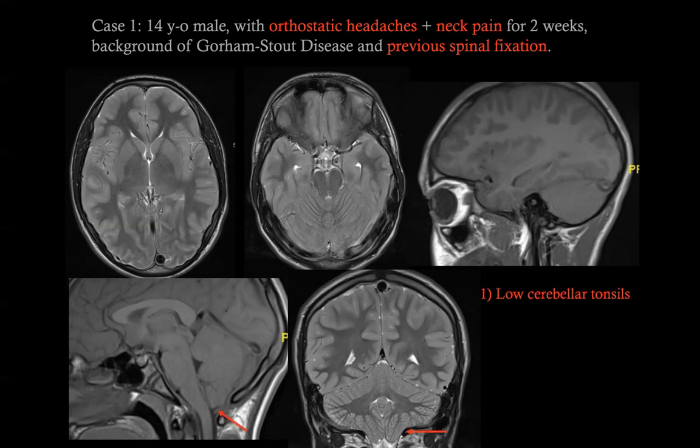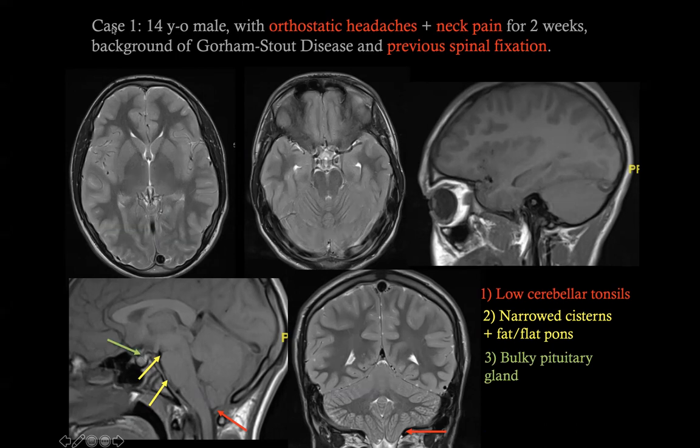So let's see this brain and what the findings are. First of all, the cerebellar tonsils are a bit low. These are non-specific findings. It depends on the cause, as you saw yesterday on Saturday. But in this case, they are definitely low. So we keep that in the back of our mind. There is a narrow cistern and a so-called fat or flat pons. Here you see the crowding of the posterior fossa in general. And there is a relatively bulky pituitary gland in comparison to what is expected in a male at this age. A female can be like that physiologically, but for a male, probably too much.